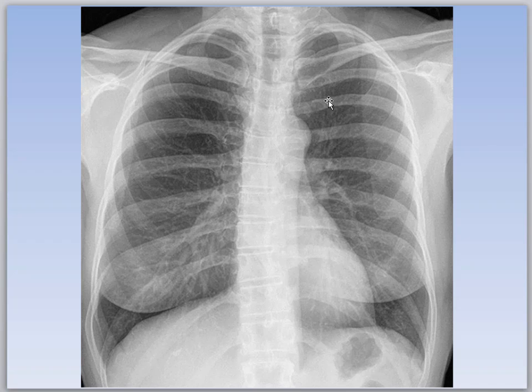All right, here's another one. Now, this patient might actually have a what? Although this type of film is not made to see the spine that well, they're shot with different factors. They do have a little scoliosis. This is more than a physiological scoliosis here, but it's still pretty minor.